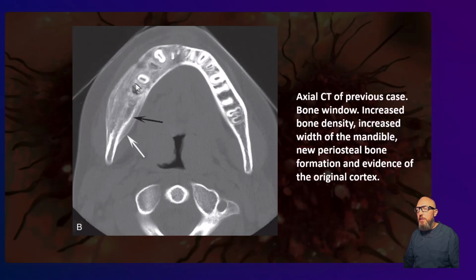And if you're just focused on the overall appearance of this, you might think fibrous dysplasia, and that's why you really need to look for these signs. On the buccal, you see it as well. And so that's our onion skin appearance, which tells you it's osteomyelitis.